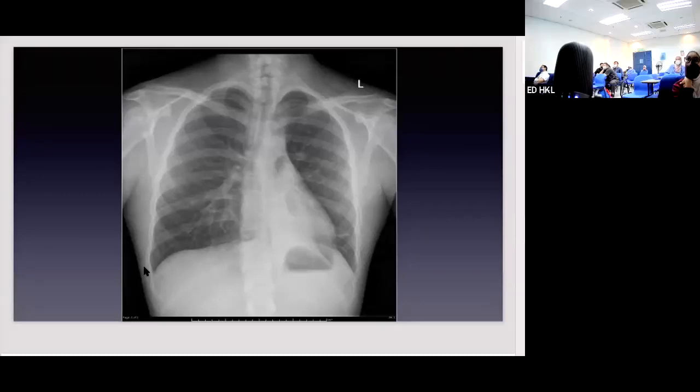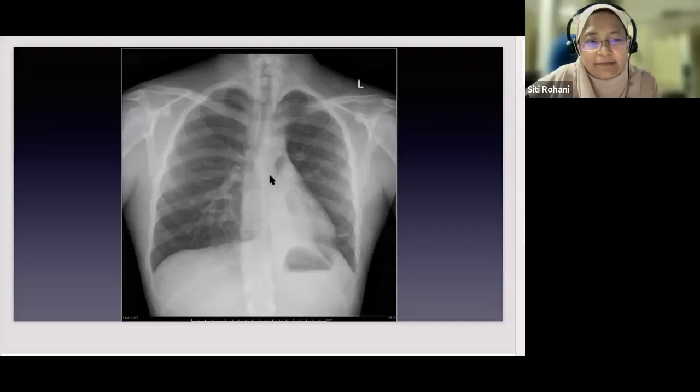Yeah. But for the collapsed lung, of course, there are more differential diagnoses that we need to investigate, like mucus plugging or something else compressing externally or endobronchial compression that causes a collapse. But detection of lung collapse in this case is important because this is the pathology.